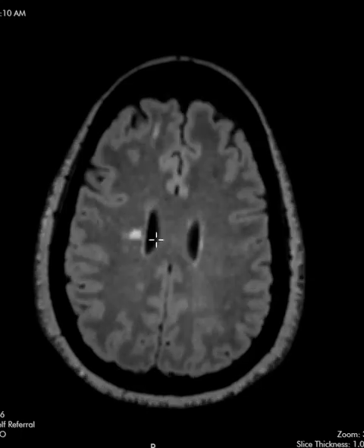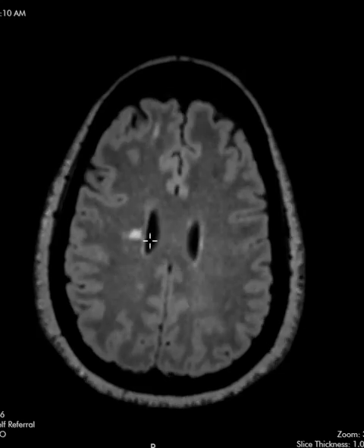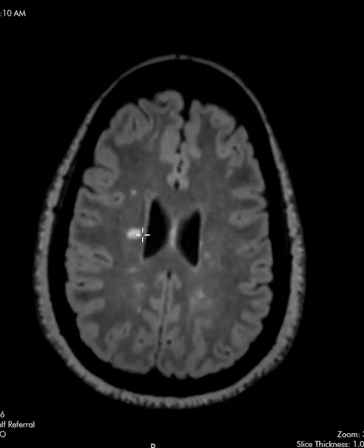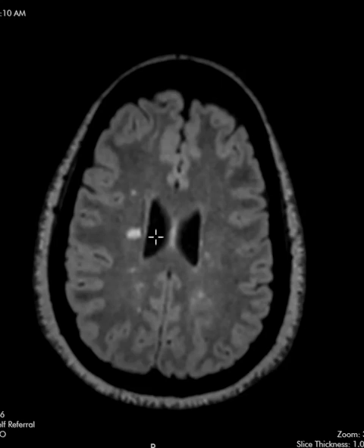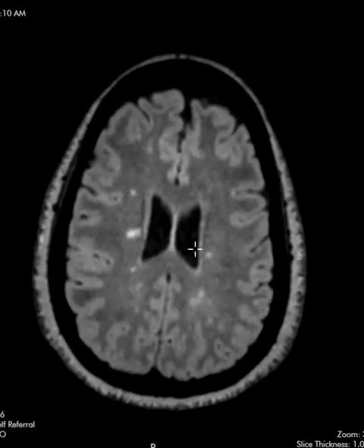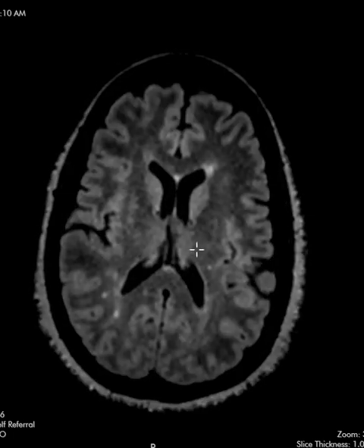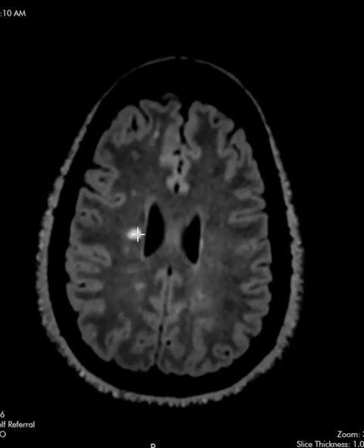So this is the right lateral ventricle, and there's a white matter lesion here that's perpendicular to the right lateral ventricle, and this is what we call a Dawson's finger. And this is multiple sclerosis oriented along the course of a vein, and when it's perpendicular like this is a really common appearance, and you could say almost pathognomonic for multiple sclerosis. So in this patient, we can have a high degree of confidence that these aren't related to migraine headaches or collagen vascular disease or some other thing. This is very likely related to MS, given the brainstem lesions and then this Dawson's finger here.